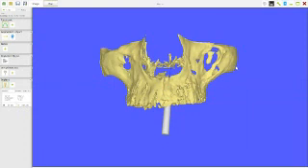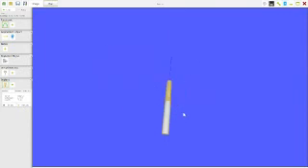And this is because the image has been what they call segmented, and the teeth density has been done on another density. And if you look up here on this segmented object button, if I right-click this here, I can click the model in and out. If I click the model, all I'm left with is the implant on the end of a carrier.